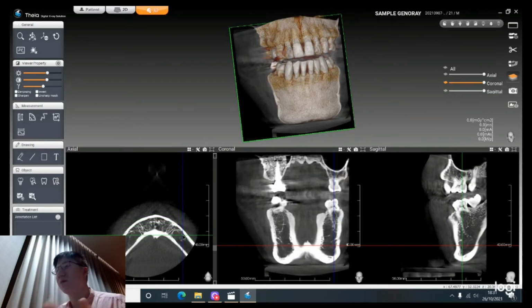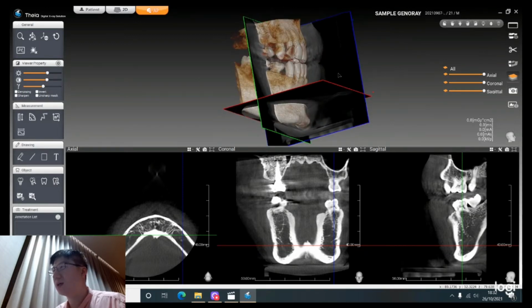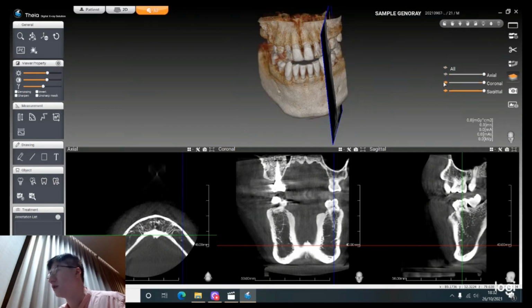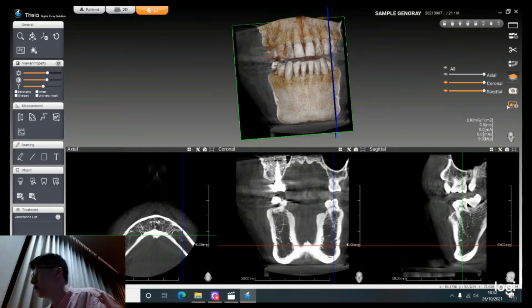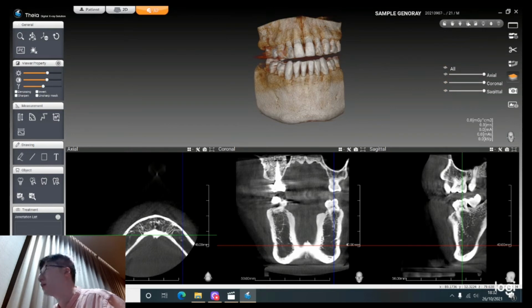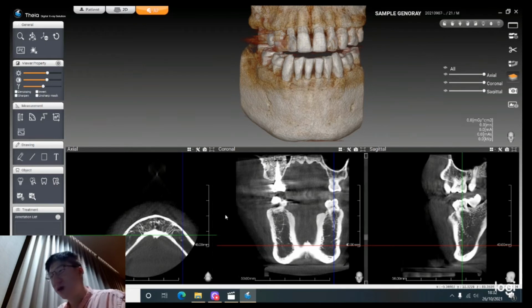So in Triana before, as I was saying, you could only view them with all the planes present, like this. Sort of annoying. And now you can see the planes individually if you want them to be, or you can see 2 planes at once. Okay, that's the plane view. Okay, and then now you have capture. This is just getting a screenshot again. Okay, and I'll turn off my plane view for now and reset my pictures. Okay, right, that's quite nice.